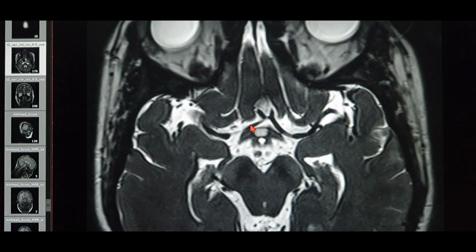Now this is the anterior cerebral artery, ACA. Now this is very important, guys, especially for the neurosurgeons and the skull base surgeons. This is very important, so listen very carefully. So this is the A1 part of the anterior cerebral artery. That's the A1. So A1 is nothing but the origin of the ACA, from the ICA to the anterior communicating artery.